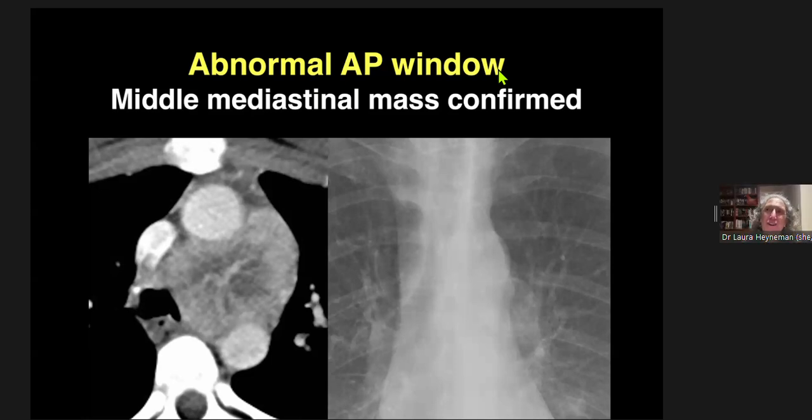So as in that first case, I determine that something is mediastinal as opposed to within the lung if its borders with the mediastinum are obscured, so that it is abutting the mediastinum, and has a well-defined border against the lung.